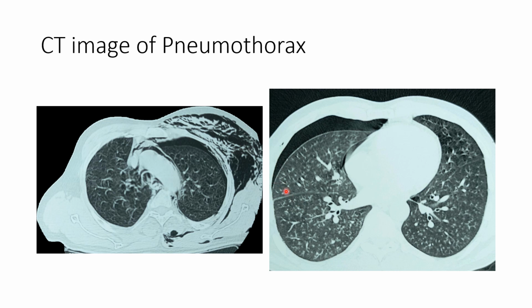So here is another picture. This is the pneumothorax. This is the normal lung. This is the pleural line. This is the pneumothorax.